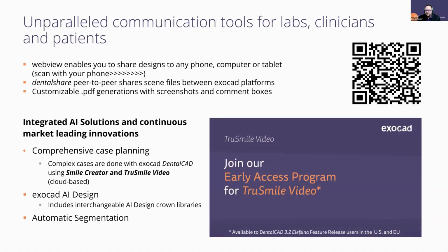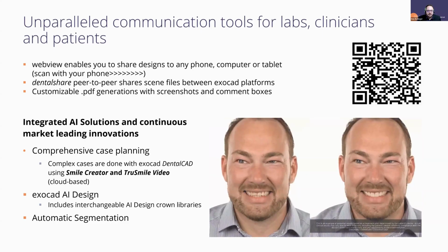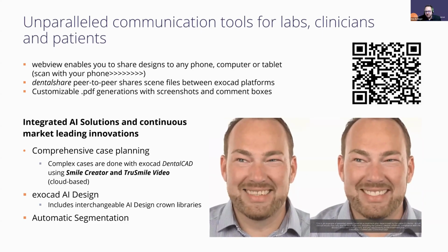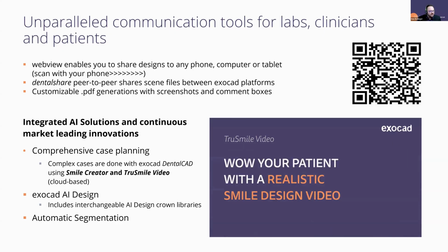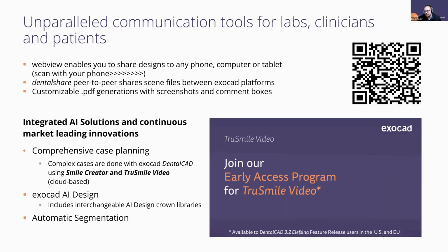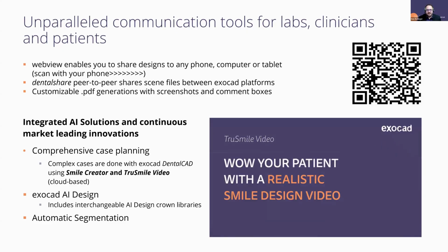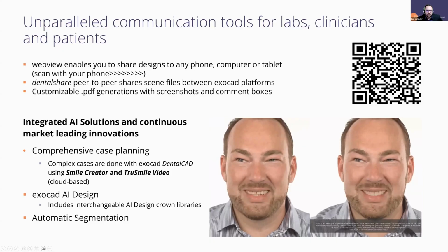And that QR code, if you all take the time to scan that, it's going to bring you to a sample web view link. Within the software, any object that you want to show to the customer for, we'll say, design approval, or you need some collaboration with your customer, it's quick, simple, easy. The person receiving the link can open that on their phone, computer, or tablet, and they can quickly view the situation within the design software you're working on.